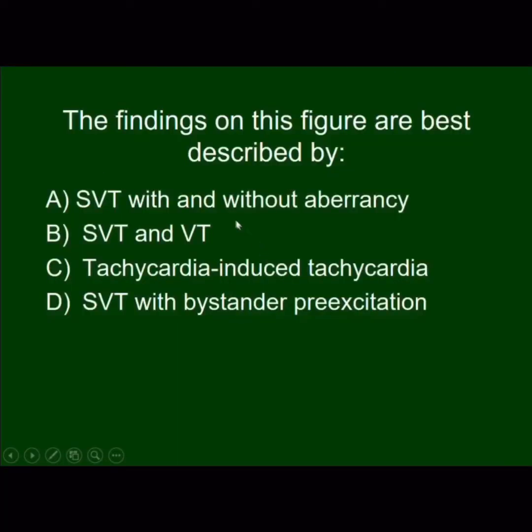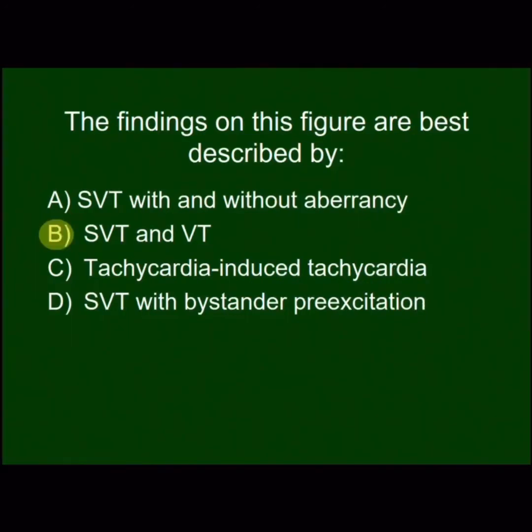And even though you may not want to call it two things, you need to call it two things. This is supraventricular tachycardia. Turned out it was AV node reentry. In addition, at the same time, you have VT. And you need to know this, and you can figure this out often on intracardiac tracings from defibrillators. Sometimes you look real carefully, you think they're one rhythm, and you find out the atrial rate is different than the ventricular rate. You have two separate rhythms going on at the same time, so you can apply the same logic. Thank you very much.